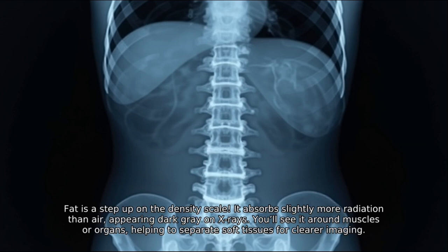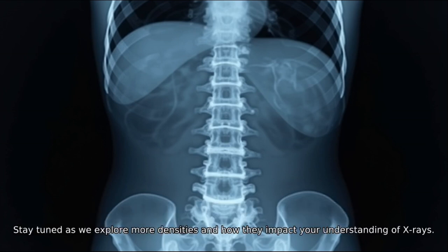Fat is a step up on the density scale. It absorbs slightly more radiation than air, appearing dark gray on X-rays. You'll see it around muscles or organs, helping to separate soft tissues for clearer imaging. Stay tuned as we explore more densities and how they impact your understanding of X-rays.